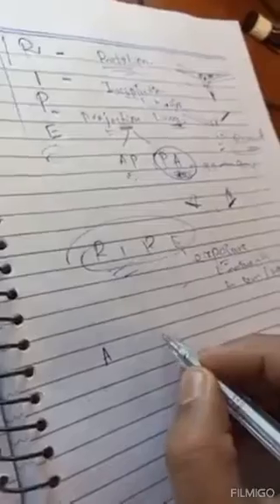Now how will we look at the diagnostic? One method is the A, B, C, D, E method of how to read the x-ray and the different organs. So some people use the ABCDE pathway. What is meant by A? A means airway, right? Airway means trachea, bronchi, bronchioles, right, and carina, etc. The point where the trachea divides is called the carina, right? So you can comment on the carina too. So in airway you have to comment on the carina.